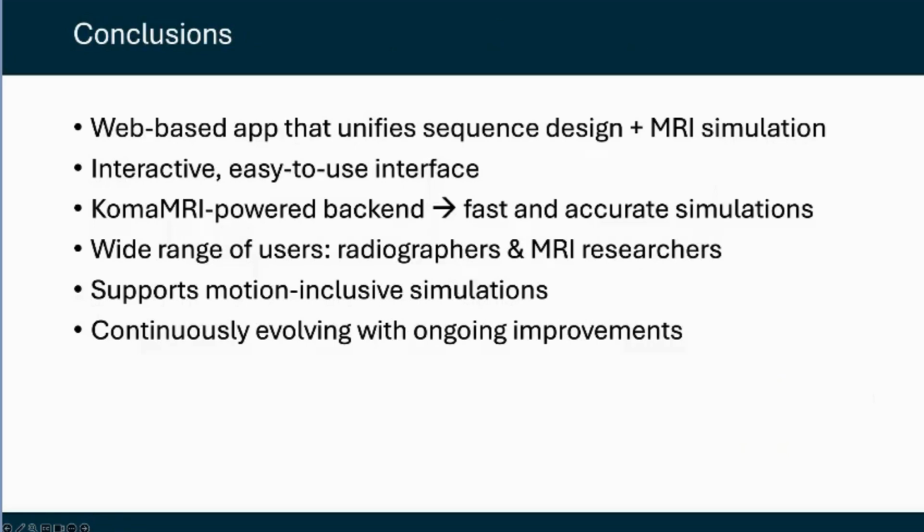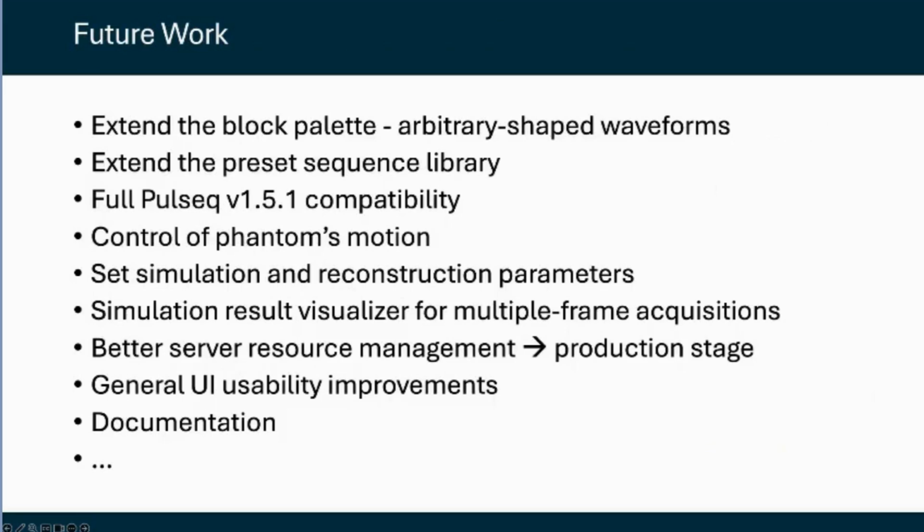So this application, of course, is still a young project, and there is plenty of room to grow. One of the first things we want to do is to extend the block palette. Right now it is quite compact, and adding some flexible elements like arbitrary shaped waveforms will really open up what you can prototype. Along with that, we would like to expand the set of preset sequences to make it easier to start from something really ready-made.